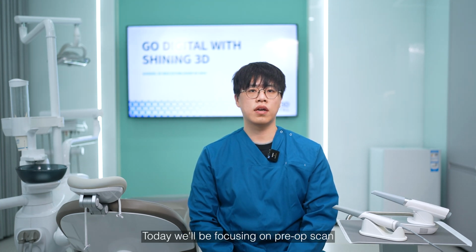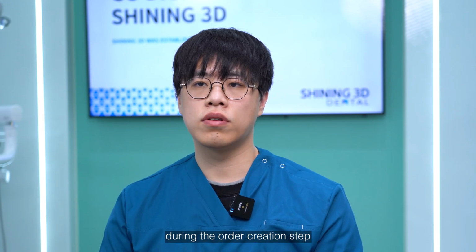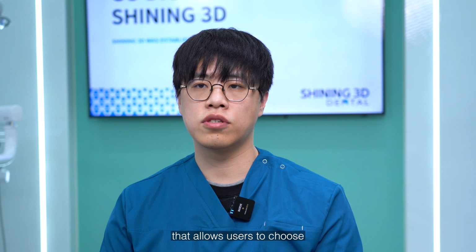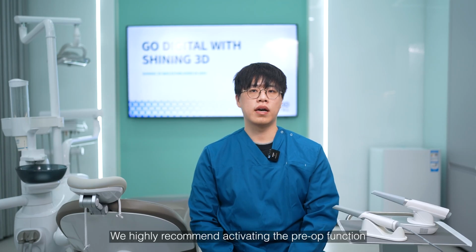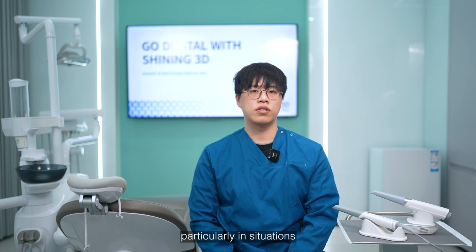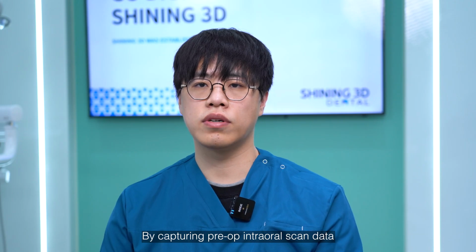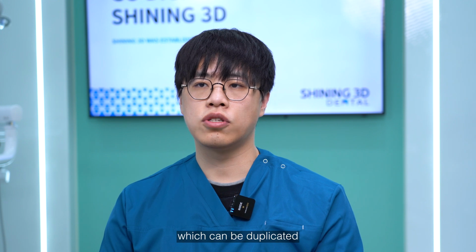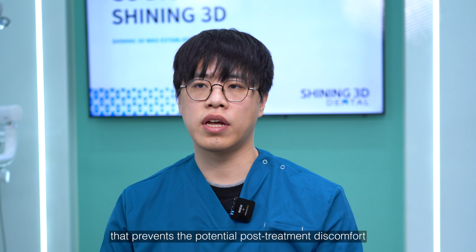Today we will be focusing on pre-op scan. You may have noticed an option during the order creation step that allows users to choose whether to include a pre-op scan. We highly recommend activating the pre-op function, particularly in situations where the patient is used to their current bite and tooth shape. By capturing pre-op intraoral scan data, which can be duplicated during the restoration design process, it prevents potential post-treatment discomfort.